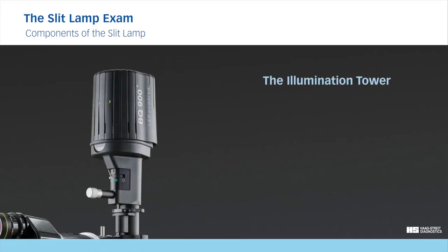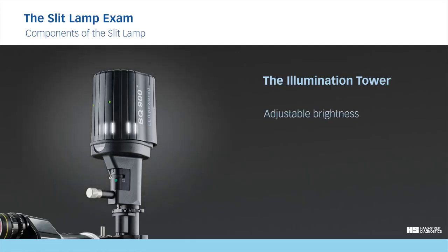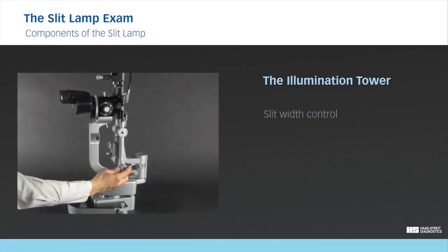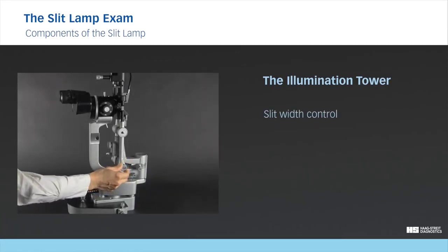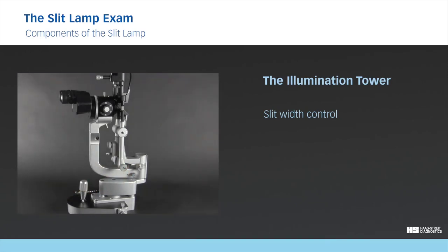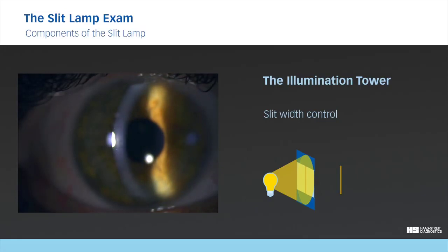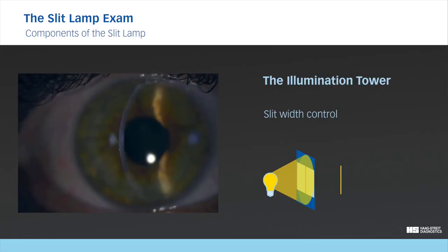The illumination tower. Central to any slit lamp is a powerful light source providing a well-balanced light spectrum that can be adjusted to the required intensity. Besides the light source itself, the main component of the illumination tower is an adjustable slit aperture within the illumination head. By simply turning the slit width control, the beam can be adjusted from wide to extremely narrow. This is important when examining semi-transparent structures in the eye without missing the necessary details.